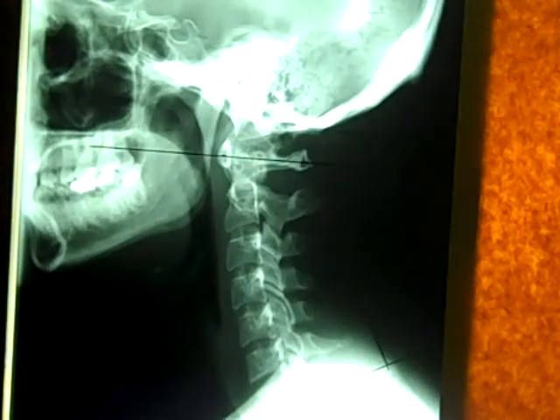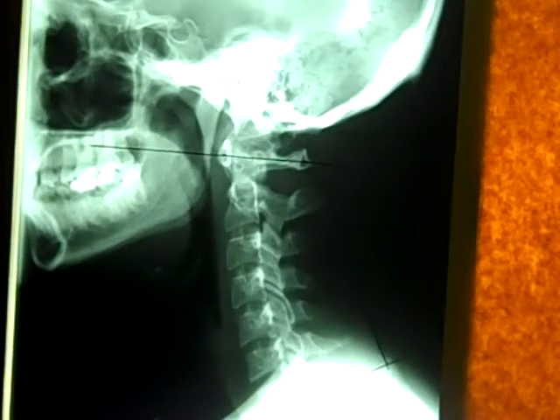Now, I'm going to move up to the wall view box, so hold on to your seat. I'm simply going to move my camera and do a lateral lumbosacral view. I need to pan out a little bit.